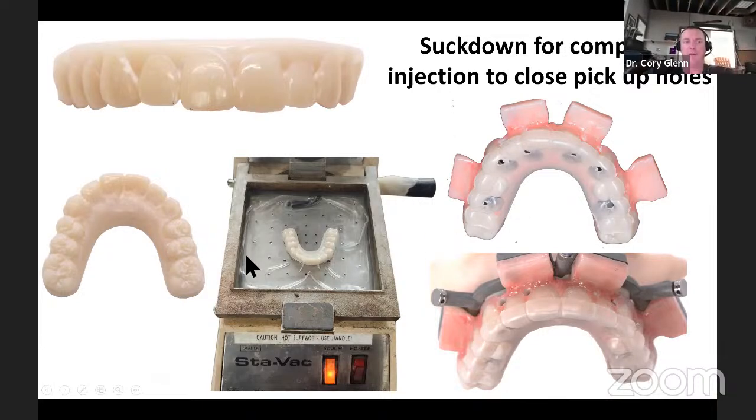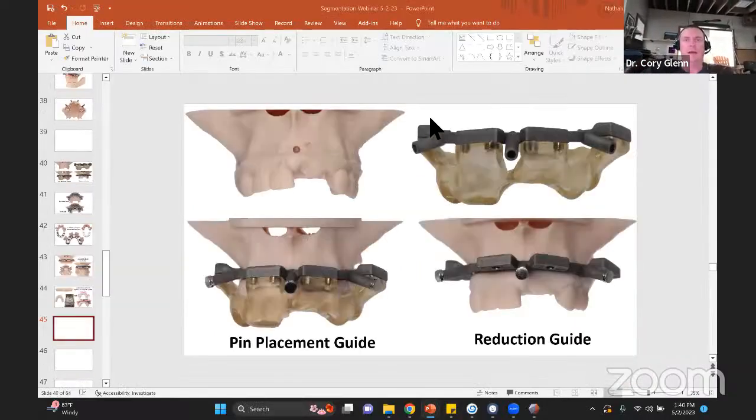And now I've got perfect pre-op anatomy. It won't look like a big patched up mess like most immediate conversions look like. It will have perfect anatomy on it. All right, so just another quick little trick.